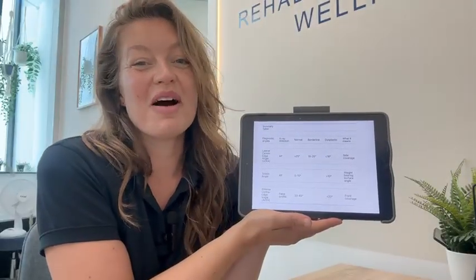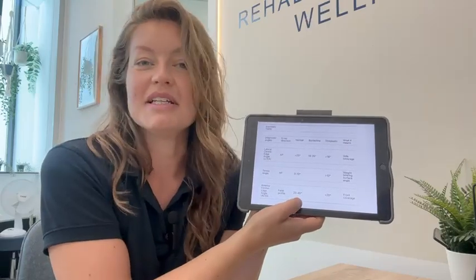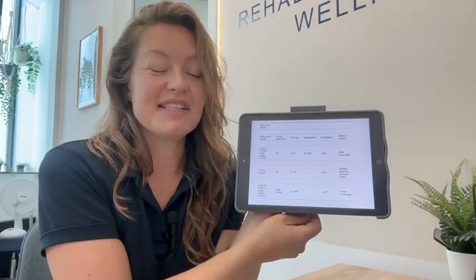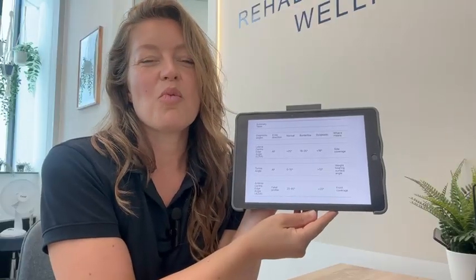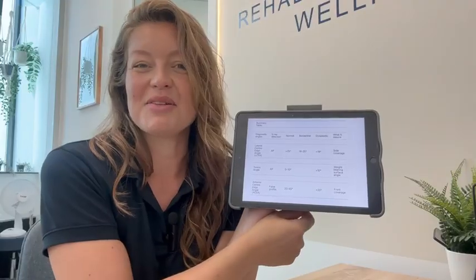So what we're looking for ideally on an anterior center edge angle is that we've got an angle of between 20 and 45 degrees. If we've got that, we've got really good coverage coming forwards. We don't have that anterior instability. If we've got less than 20 degrees, it just makes us question how much stability we have, what extra strength we might need to be able to get, or it might help determine surgeries that we might be having going forward.